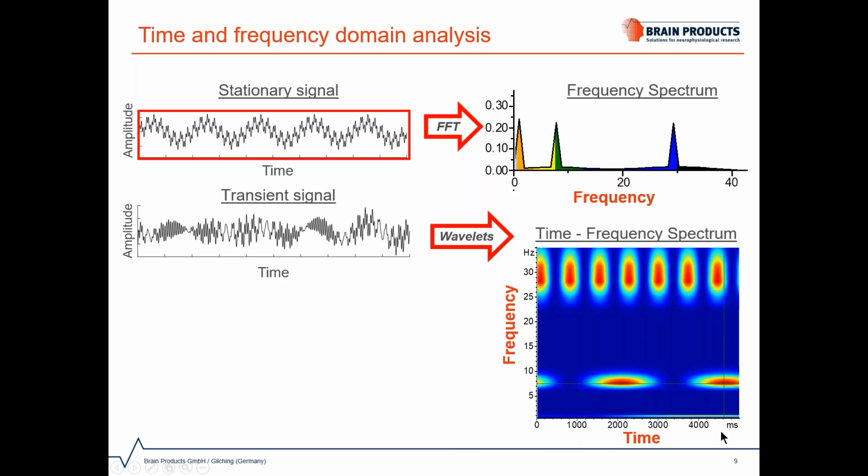For example, in this time-frequency map, amplitude or power is color-coded, and we can see how it changes over time. This time-resolved spectrum is in particular important for connectivity analysis because connectivity patterns are often not stable over time, and these patterns may not be visible when mixed with time intervals that do not show connectivity.